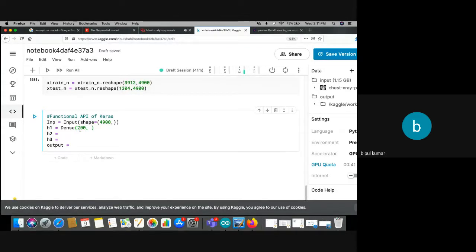This time I'm not using a multiple of 16, so that you should not think only multiples of 16 can be used. ReLU, this is what I have defined. Thereafter, defining the name of this layer is optional, like h1. This is your first hidden layer.